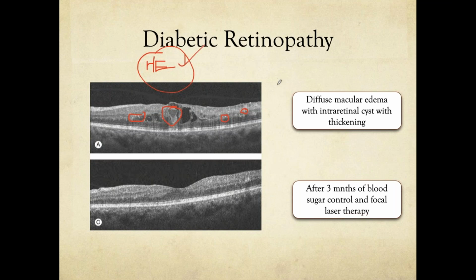diabetic retinopathy because it is the presence of the hard exudates or the hemorrhages that upgrades the mild diabetic retinopathy into a moderate diabetic retinopathy. So when the criteria of the hard exudates and hemorrhages have been considered for upgrading the diagnosis from mild to moderate diabetic retinopathy, you cannot just say hard exudates. You also see them in other pathologies. So you have to consider hard exudates in this as well.